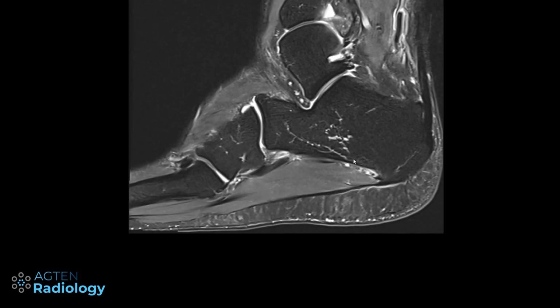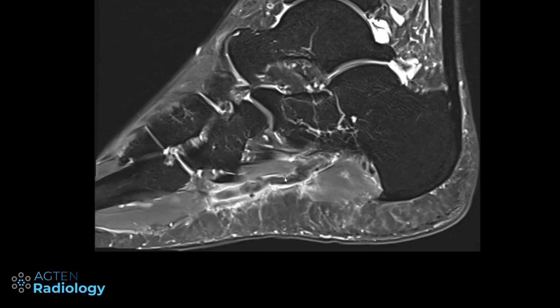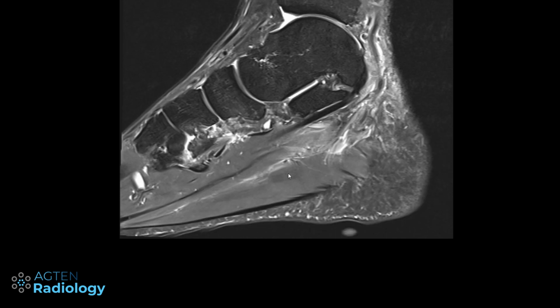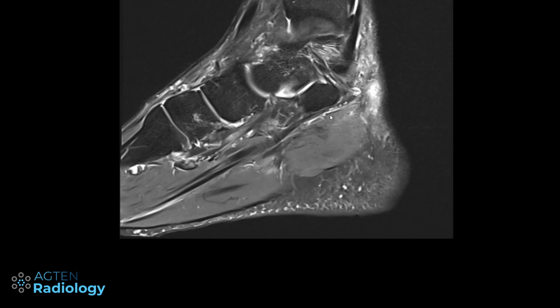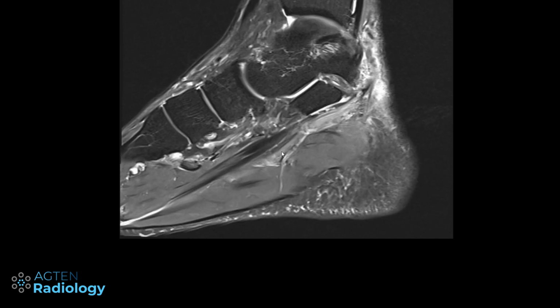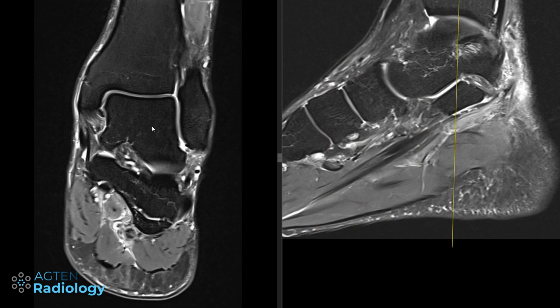So we can either go on the lateral side, the lateral malleolus, and then we just go here and we see this is the first vein that's coming. So this is the lateral plantar vein. Already by that we are sure about that. And then when we go here, we have the medial one, which we don't really see nicely. Maybe it's going down here. Now obviously we can always check a second plane, which should make things easier.